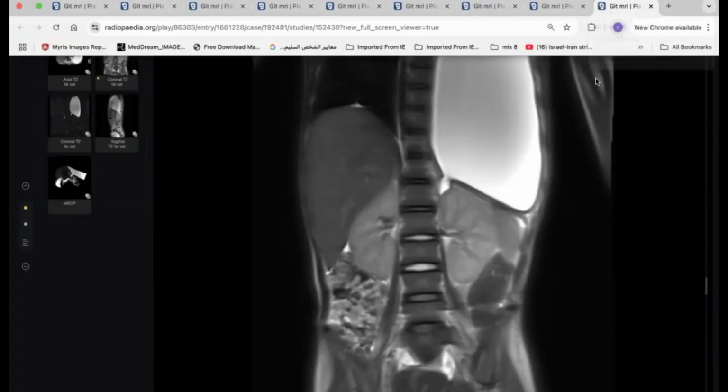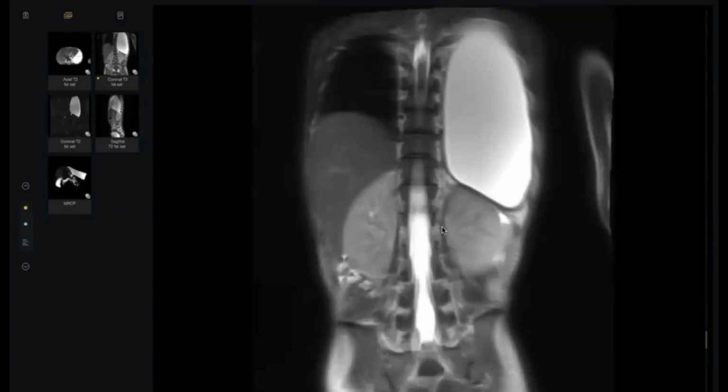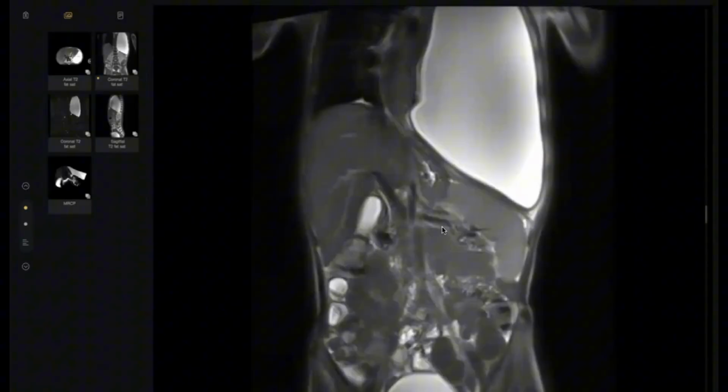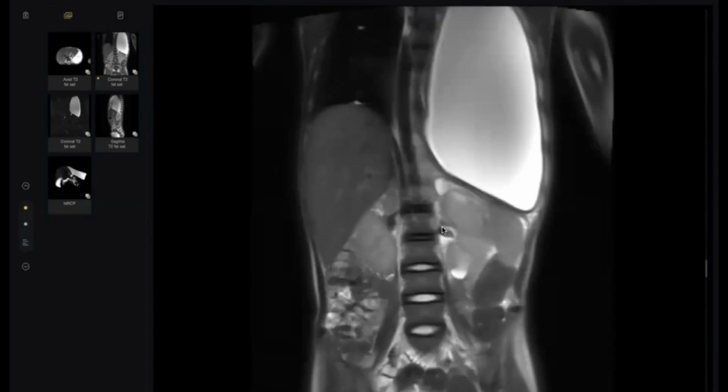So, my colleagues, in all recurrent huge pleural effusion, check any defect here, check any connection with the pancreas or the colon. I think during our Viva, we show this case. This is the third time. Once it was pancreatico-pleural fistula, and the other one was colonic pleural fistula. Thank you, doctor. Next candidate.